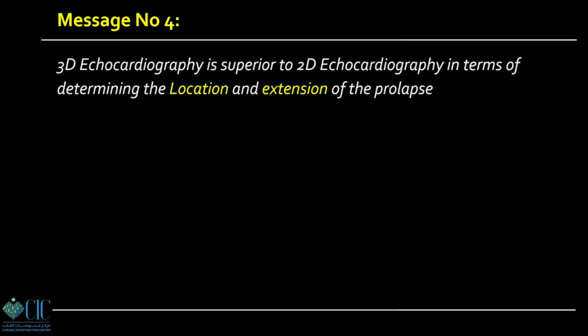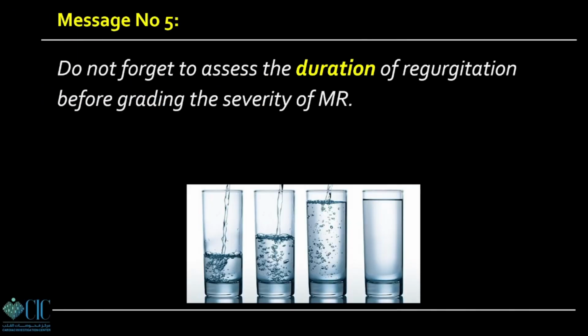3D has a lot of added value in determining the location and extension of the prolapse, and the duration of mitral regurgitation is very important.